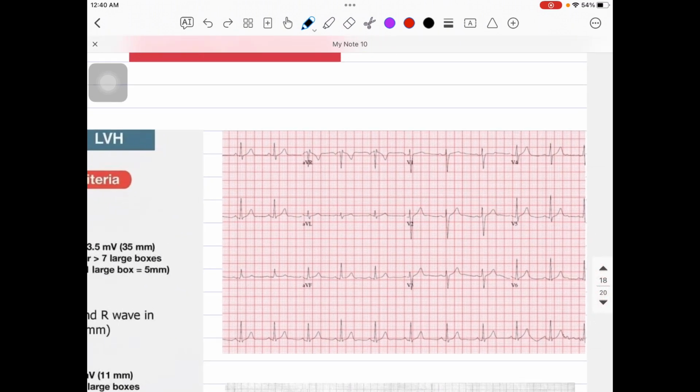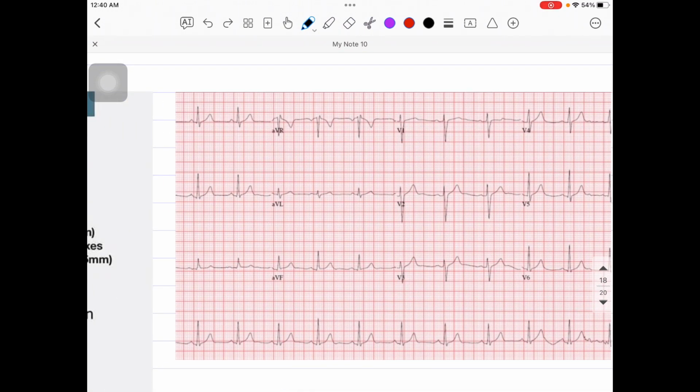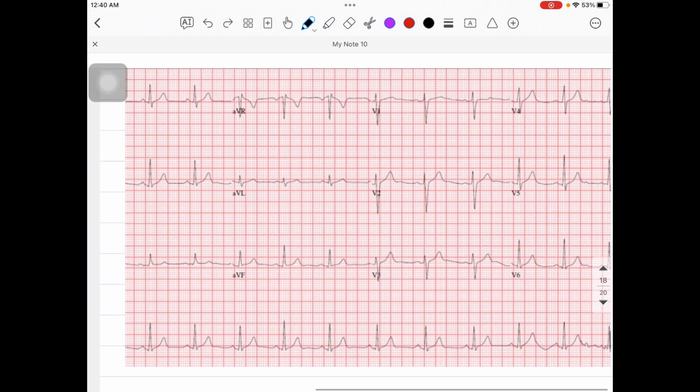So guys, firstly I will share some basics with you before going into the LVH and LBBB per se. So firstly, this is the normal sinus rhythm ECG. If you see, this is the second lead given over here, that is the rhythm lead, as we have talked about earlier as well. And here you can see that the RR intervals are equally placed, that is, this patient is having a regular rhythm. And the QRS complex is also narrow with every rhythm.